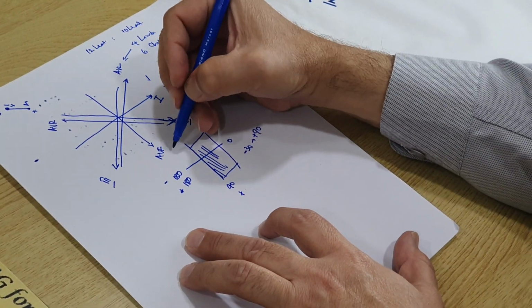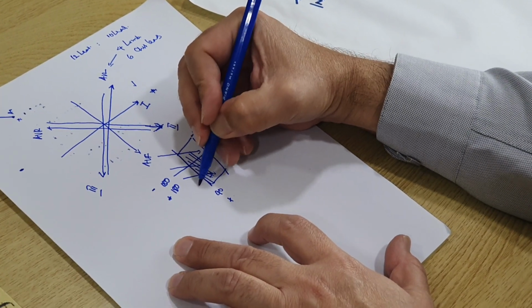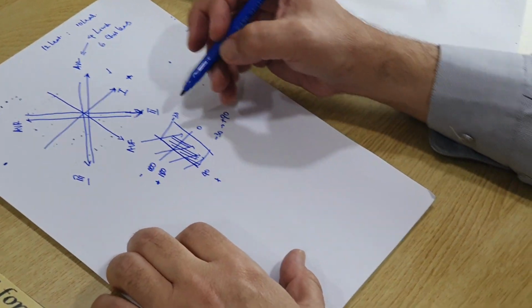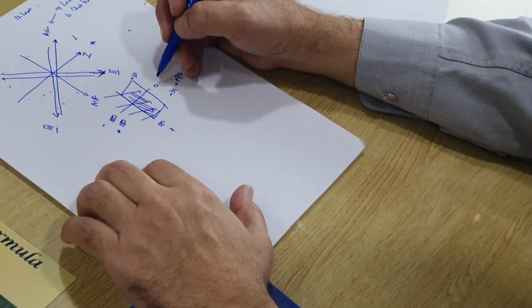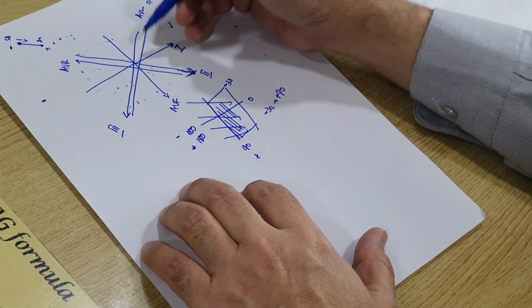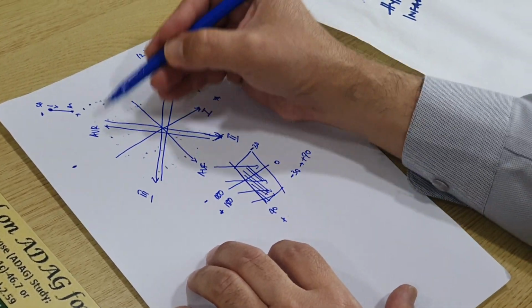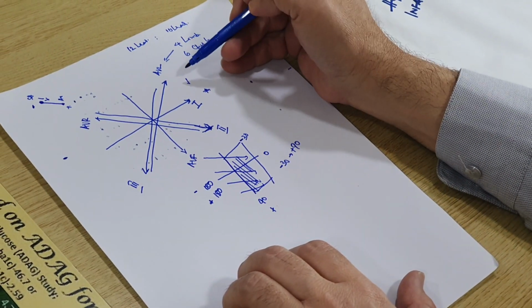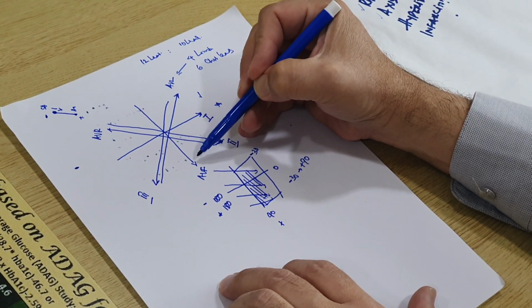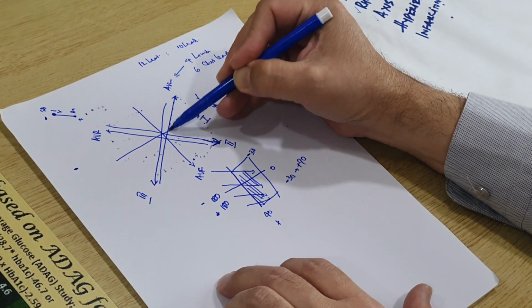And wherever the axis is, as long as it's in this direction, we call it a normal axis. So if the axis is minus 10, it will be a normal axis. If the axis is plus 60, it will be a normal axis. And this axis can be calculated from these different leads. So in other words, the axis normally will fall somewhere here, and this is the normal direction of the cardiac axis.